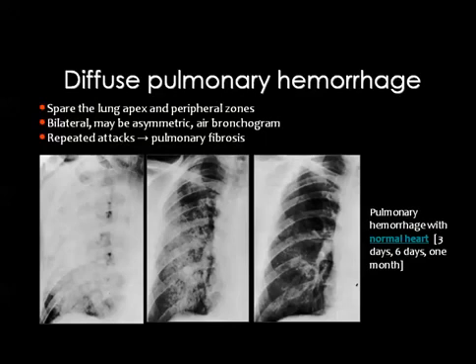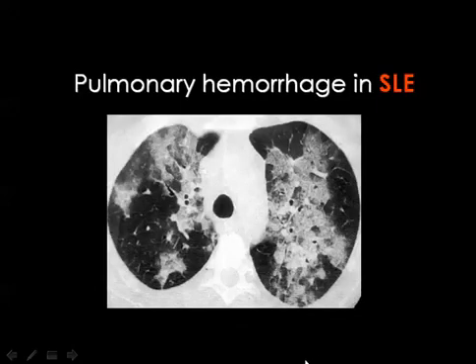Then the edema has clinical data that are quite evident. Hemorrhage also has clinical data that are evident, but please note that some of the patients who have pulmonary hemorrhage do not have hemoptysis. This is very important. Okay. Then, if you look here, this patient has systemic lupus, and this is one of the diseases that can cause vasculitis and bleeding. Then you see opacities in the lung.